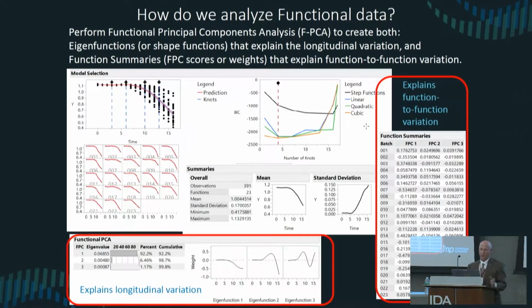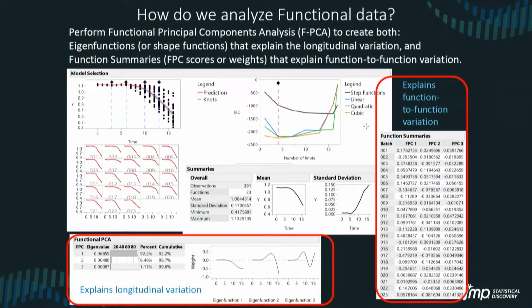So here's how we do it. I think I'll use the laser pointer here. Up here you can see we've got a bunch of data versus time. It starts out that everything is pretty constant, and then after a certain point in time, we start to see variability. The red line here is just the average through the data. These are each of the individual batches here.